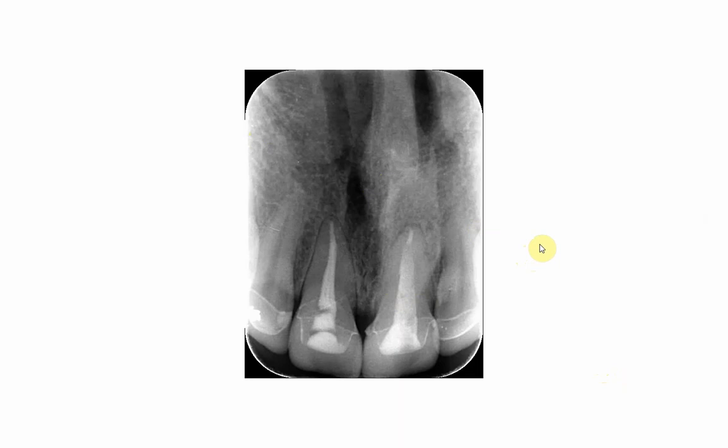Here the images will appear shorter, plus you will see the image of the nasal cavity, because the X-ray is coming from the top, so it passes through the nasal cavity and then it will cast its shadow. See, most of the premaxilla is appearing here, though the teeth are fully appearing in their length from the crown up to the root.